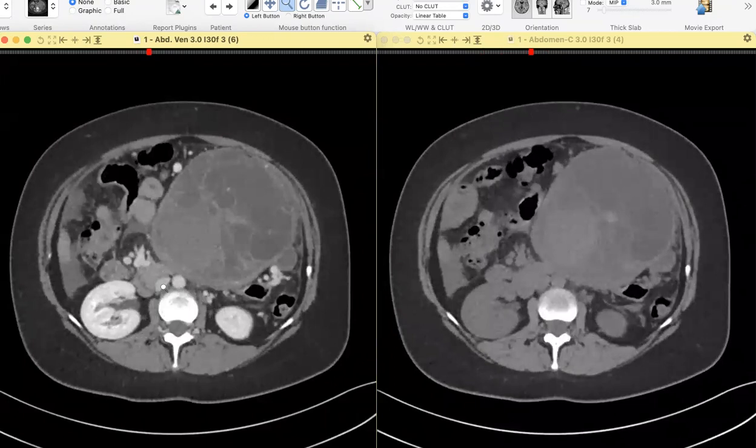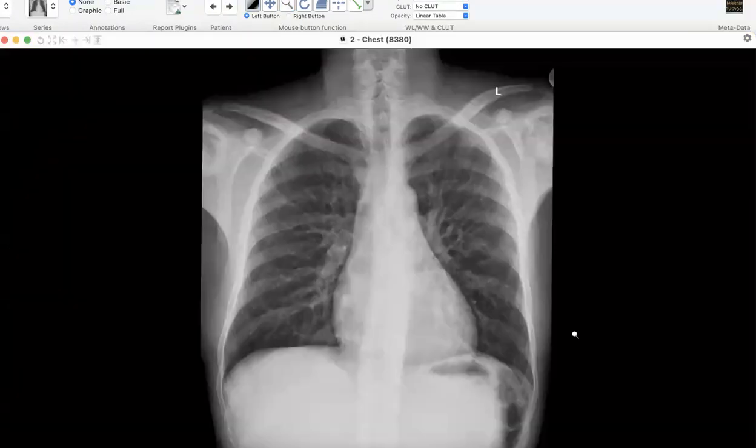Hi, Dr. Wasif. Hi. So your first case, a 30-year-old patient with chest pain. This is a frontal chest radiograph of a patient complaining of chest pain. I am reviewing: lung apices appear intact, retrocardiac region appears intact also, no subdiaphragmatic problem.